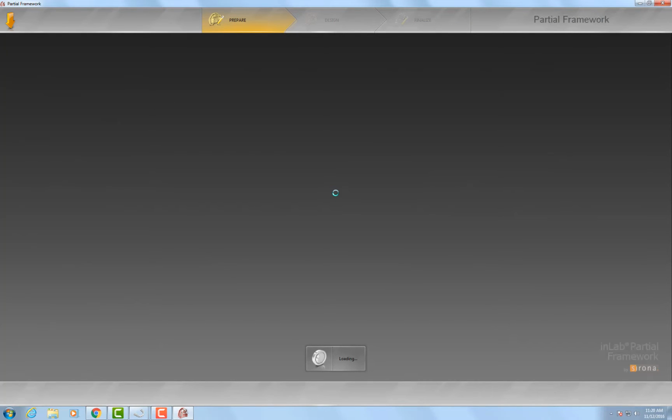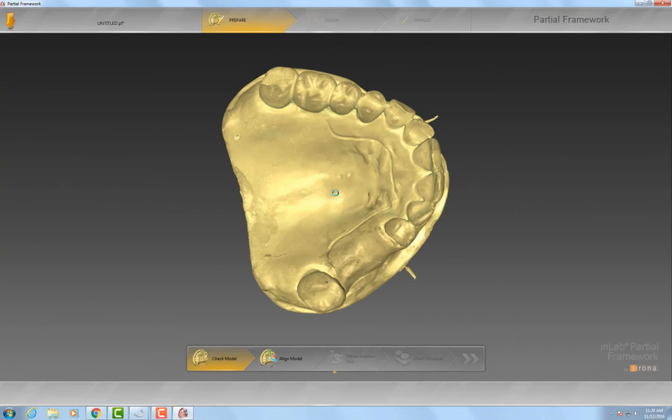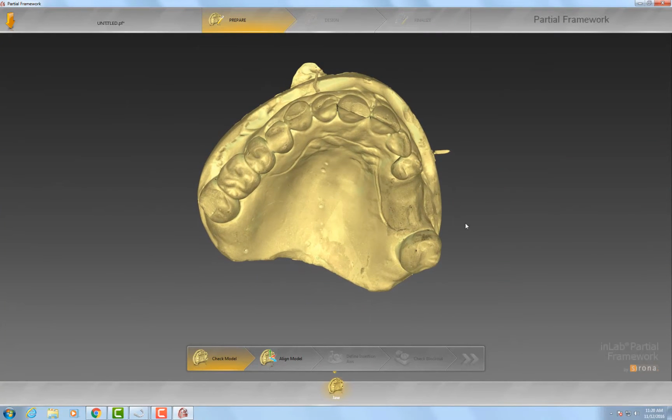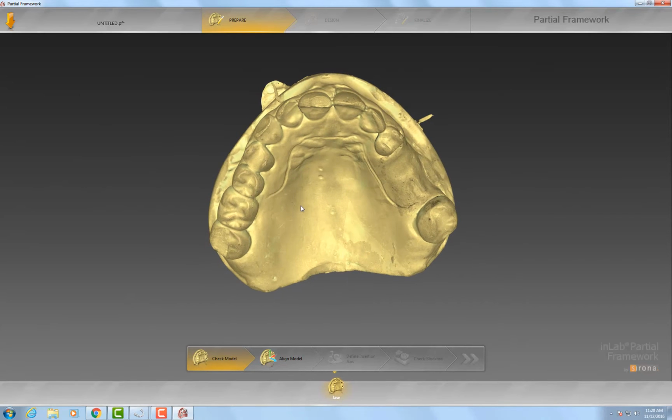You can manufacture these designs in your MCX5. You can manufacture them in a 3D printer with casting material. You can manufacture them through SLM manufacturing, which comes to you in metal through different companies. On the website you can submit your RPD designs to Sirona and they will come back to you in metal, at whichever stage you want them to do.